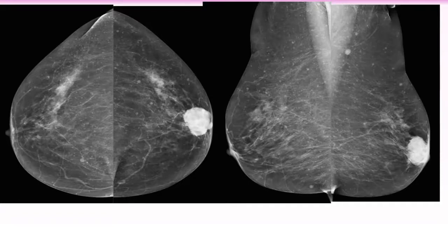Regarding the other diffuse small dense lesions, is it an artifact? No, not an artifact. So it's on a background of ductectasia, this lesion.